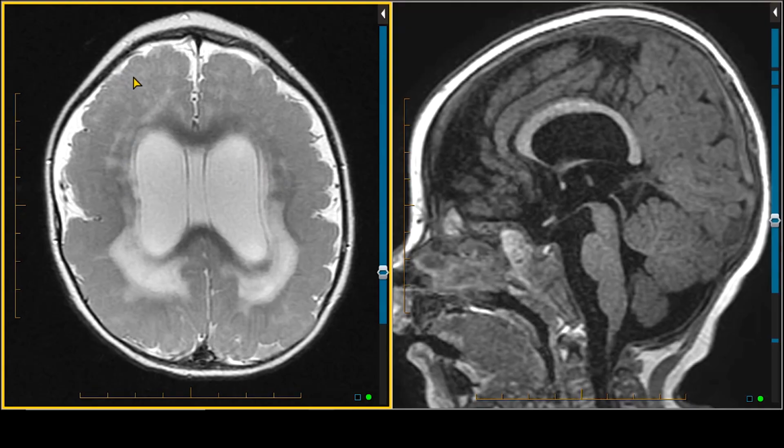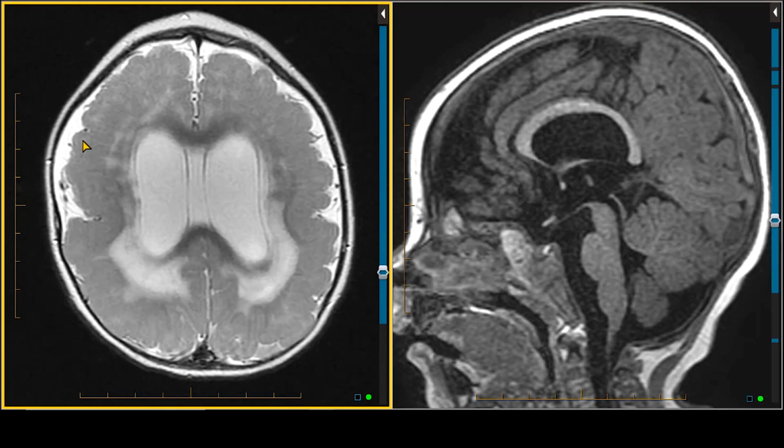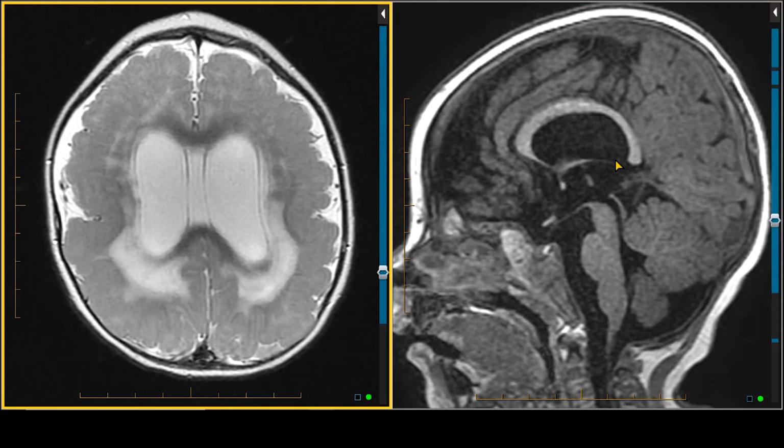In addition to that white matter injury, we're seeing an abnormal sulcation pattern. We're seeing shallow, narrowly spaced gyri. This is polymicrogyria. Now, it's a little more challenging to see in this case because, first of all, myelination in a 1-year-old is not as much as it was in the other cases. Secondly, there's diffuse white matter injury. So that makes seeing the polymicrogyria a little bit more challenging.